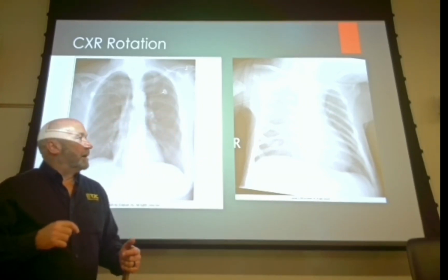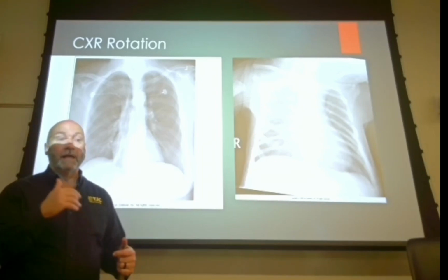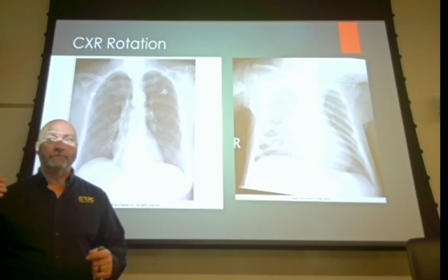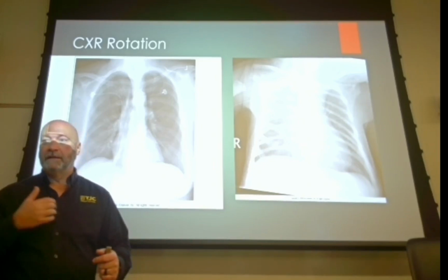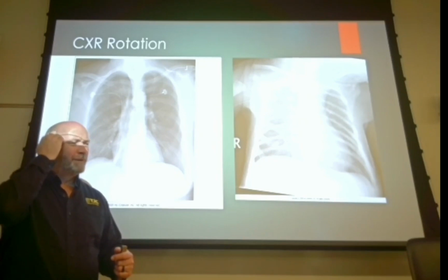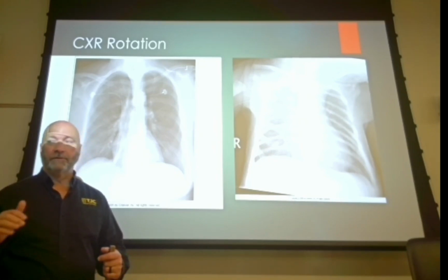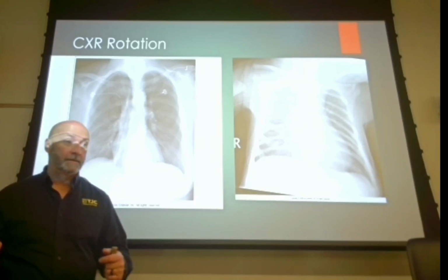All right, so in your children, you're going to get a better outcome shooting your children AP as opposed to PA. I know all of our literature says shoot PA at 72 inches, but pediatric children have a large heart anyway, and all your radiologists know it. And one of the most particular radiologists I ever worked with said that under the age of 7, it really doesn't matter if you shoot AP or PA.